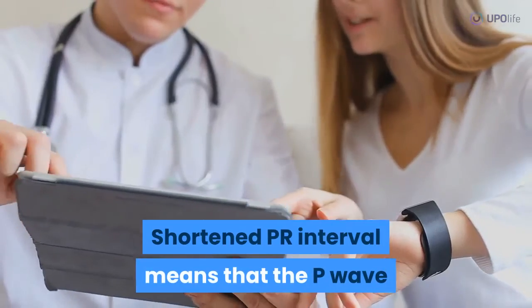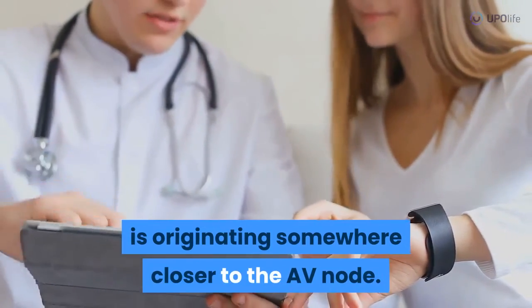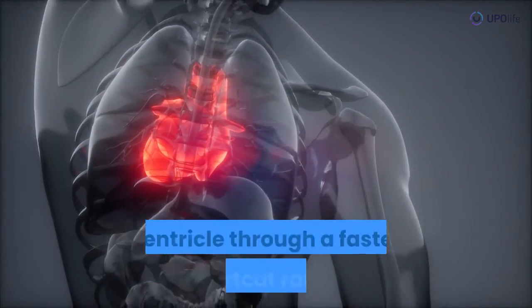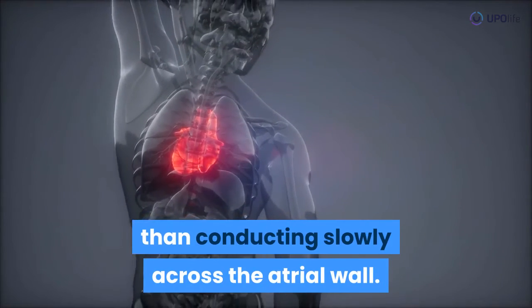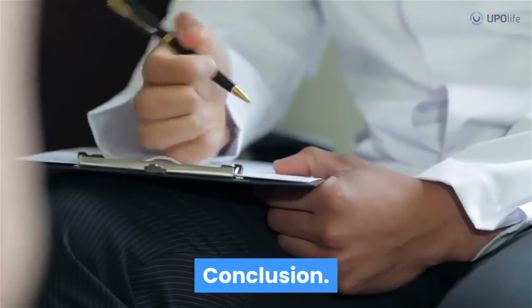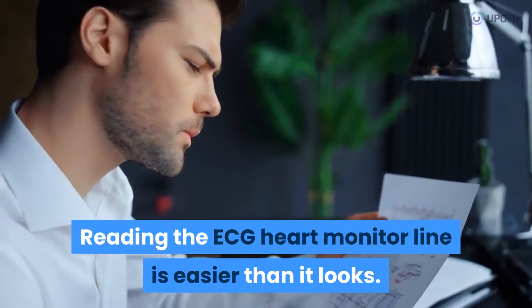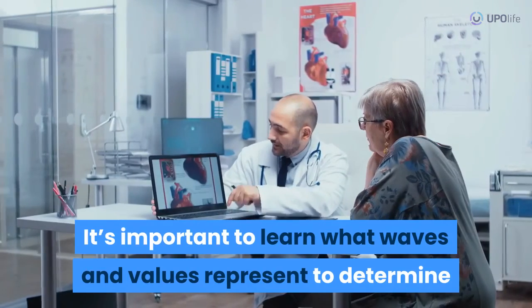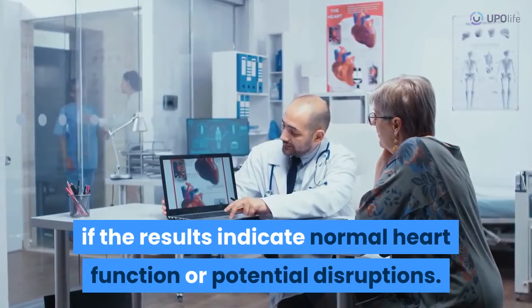A shortened PR interval means that the P wave is originating somewhere closer to the AV node. It can also indicate that the atrial impulse is reaching a ventricle through a faster shortcut rather than conducting slowly across the atrial wall. Conclusion: reading the ECG heart monitor line is easier than it looks. It's important to learn what waves and values represent to determine if the results indicate normal heart function or potential disruptions.